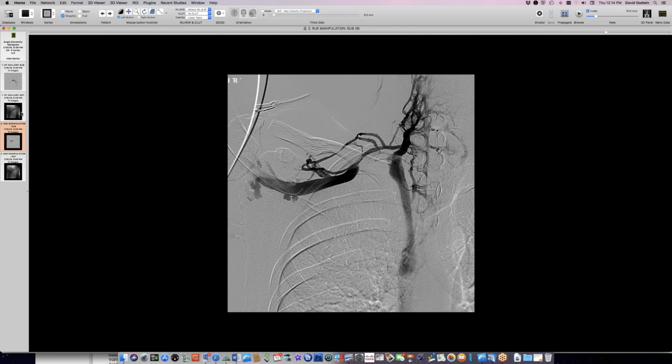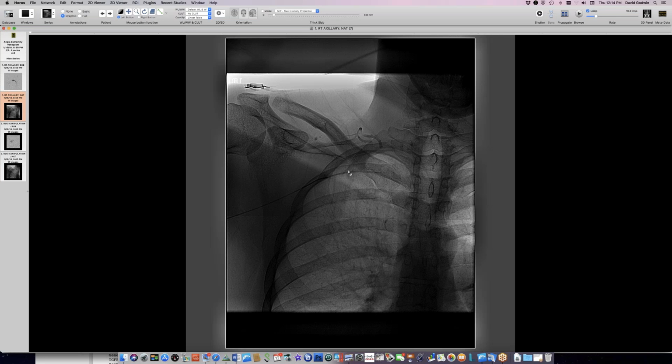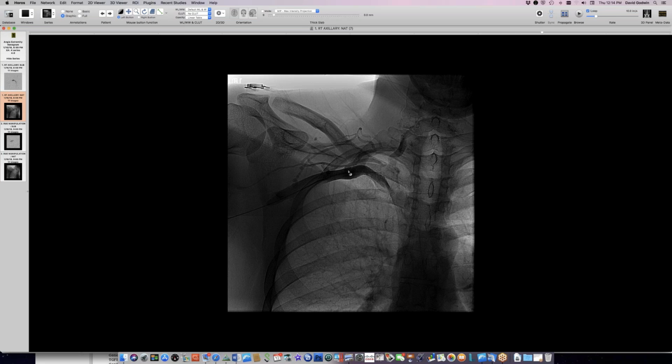with manipulations. I'll have to read about what the form of manipulation was, whether it was just moving the arm or what. This fellow ended up having a resection of the first rib to free up that space. This is attributed to muscle swelling or muscle hypertrophy from having big muscles from, say, mountain climbing. This guy was a mountain climber. He liked to hold onto rocks with his fingertips and stuff like that. It may be positional partly. It's a kind of thoracic outlet, or inlet I guess in this case, syndrome that involves pressure on the vein.